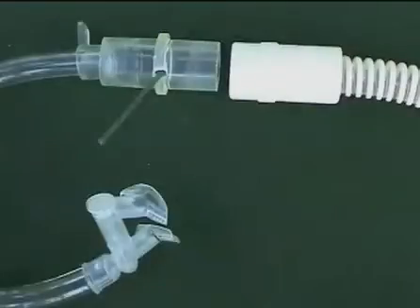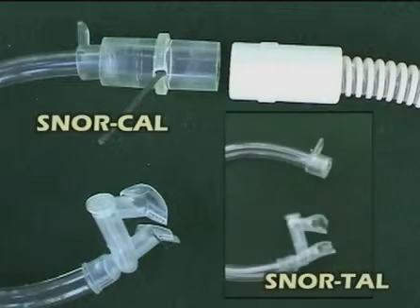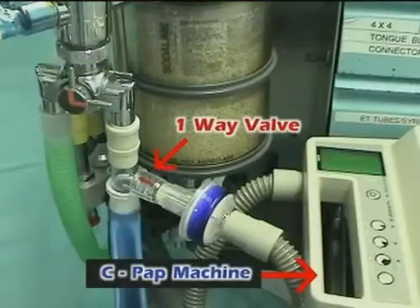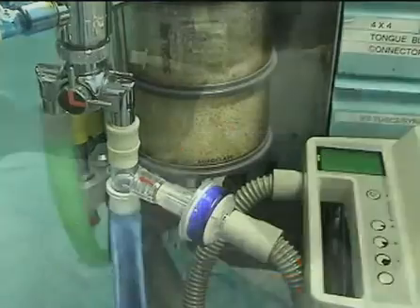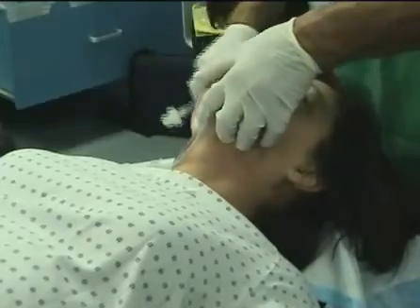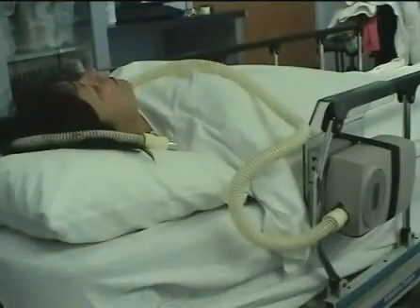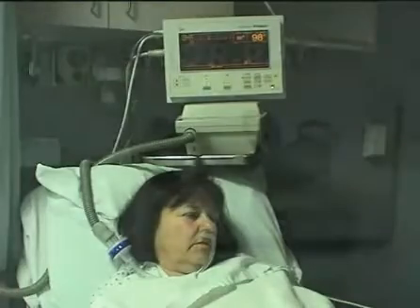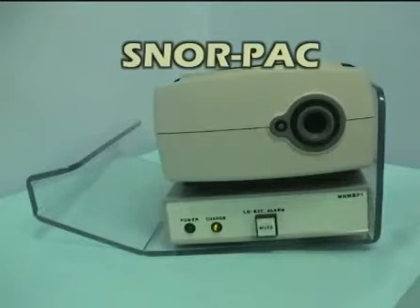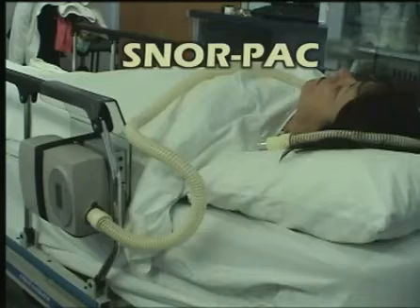The SNOR CPAP assist linkage, or SNORKEL, configures the SNORTAL with a vented connector to prevent the rebreathing of carbon dioxide. Attached to a CPAP machine, the SNORKEL is indicated for the delivery of CPAP. This arrangement can prevent obstruction upon extubation at the end of an inhalational anesthetic and will optimize gas exchange during transport to and through the recovery room. The SNOR pack is a lightweight battery pack and carriage assembly which powers an attached standard 12-volt CPAP machine. The SNOR pack is indicated for the continuous delivery of CPAP during transport of the patient.